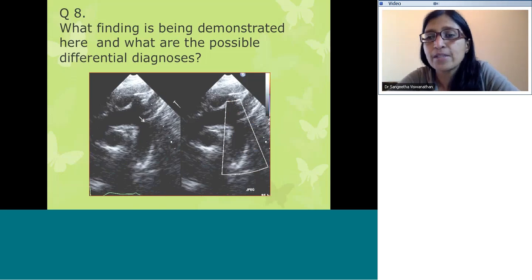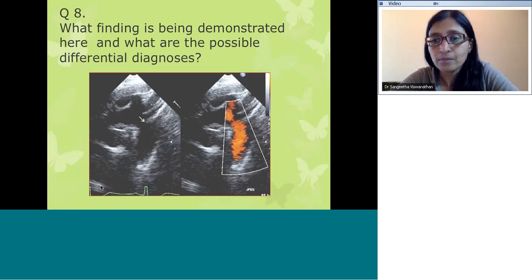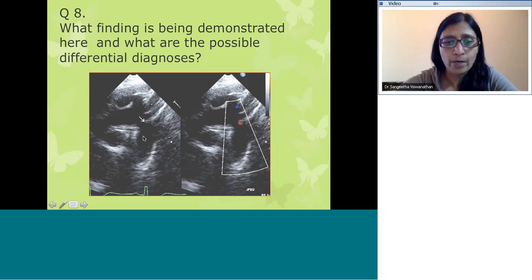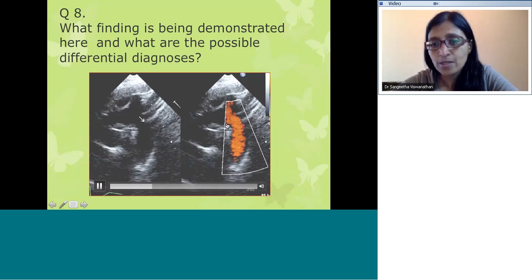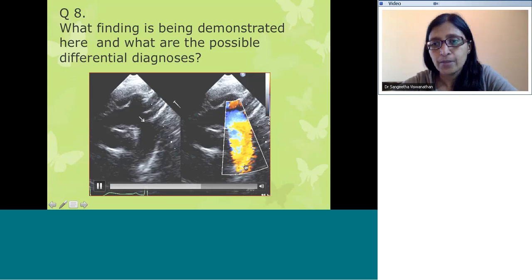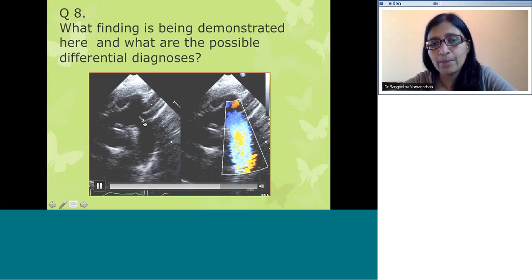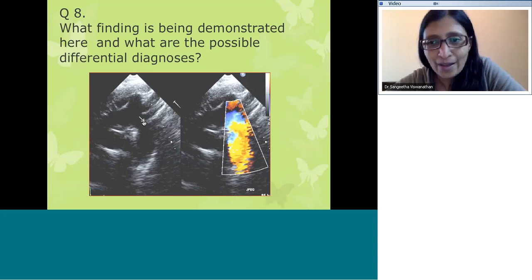A simple one, we've discussed this many times before. Who said posterior shelf? Correct. So the aortic arch is actually widely open. There is no posterior shelf or any shelf here. You can see during the forward flow, there is broad flow, no obstruction. This is not a posterior shelf. Usually a posterior shelf will be found here. Maybe that arrow is a little distracting. Ignore the arrow, okay?